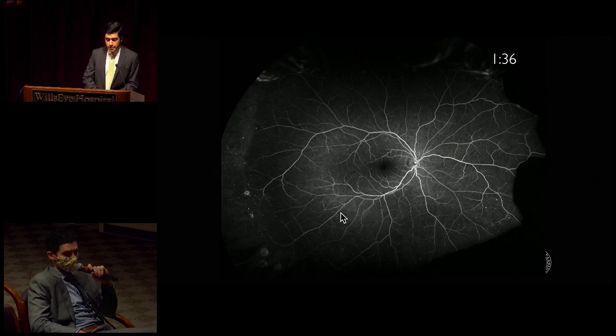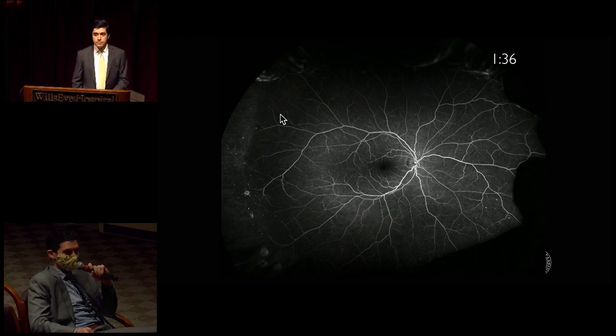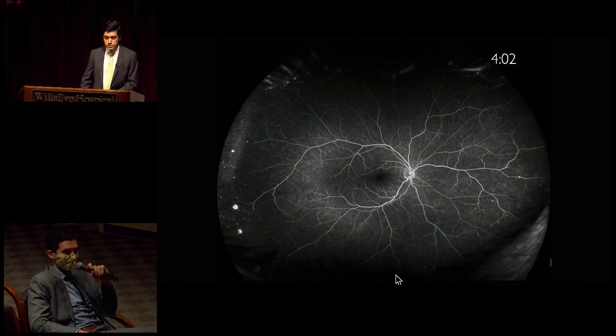The asymptomatic eye. So fluorescein angiography of the right eye at 1 minute, 36 seconds. Again, we are in full AV phase here. Similar findings as those seen in the left eye, where there are these scattered microaneurysms, maybe a touch of non-perfusion out here in the far temporal periphery, these well-circumscribed staining versus window defect areas here, but no leakage, and the macula and the blood vessels proximally look within normal limits. And a later frame, I think, just redemonstrates essentially the same findings, no leakage.